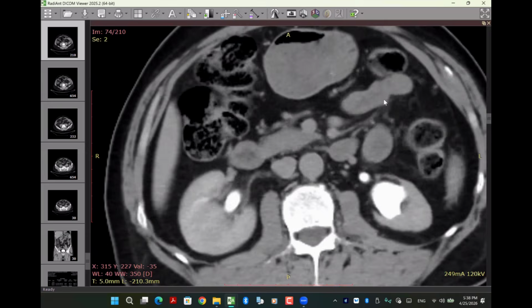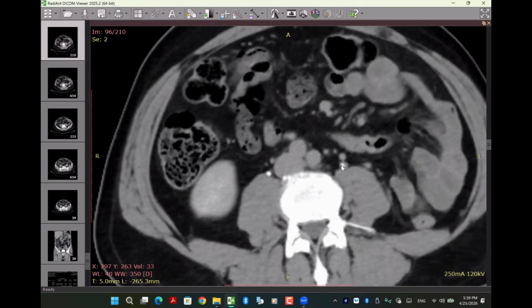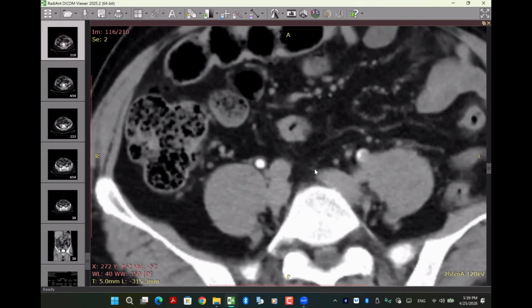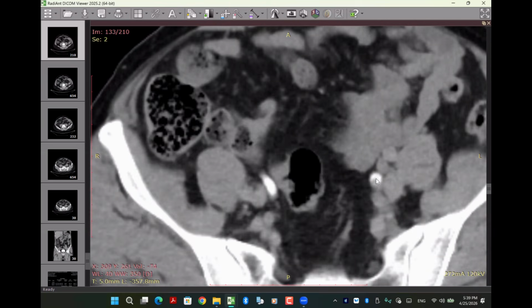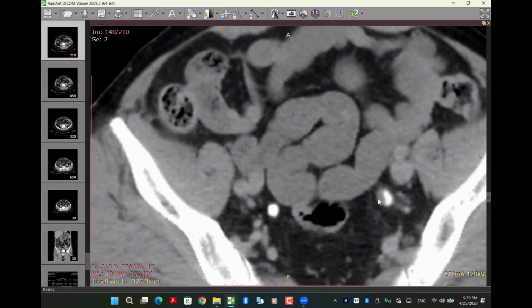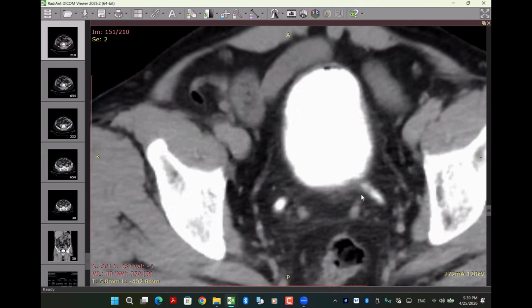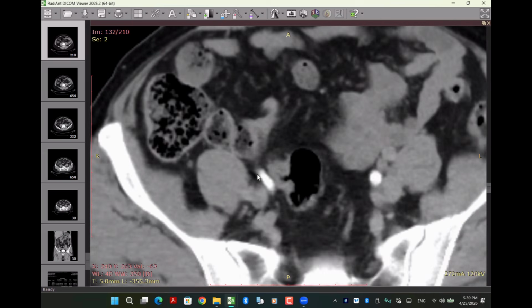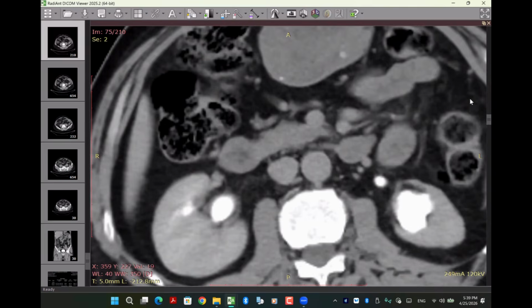Let me stop you for this comment, if you just give me control for one second. Look, trace this ureter. Trace that one. Stop. What is this? Go more. What is this? Okay, just a second. And the ureter will go straight forward into the vesicle. Trace the other one. You got my point?